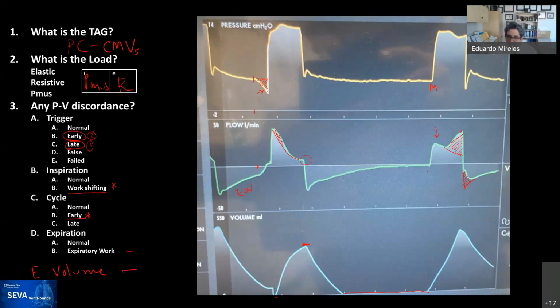I'm going to stop there. Rob, comments? Yeah, just to add to what you just said, ventilator volume waveforms reset every time flow crosses zero. So you don't actually get an accurate picture of what's happening in the lungs. You can have a much larger volume in the lungs at end inspiration than the ventilator is showing, like in this situation.